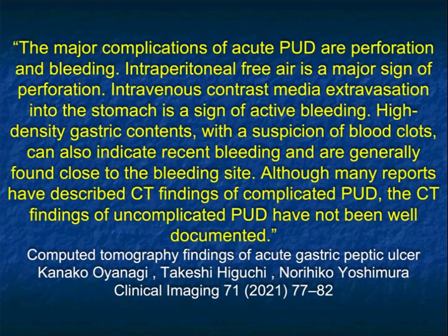We also, as I mentioned, like to use IV contrast. Without IV contrast, it's really impossible to see active bleeding. You can see blood in the stomach, but you don't know if it's active bleeding on a non-contrast scan. There are several pitfalls. Obviously, patients with medication, for example, Maalox has high CT attenuation and can very much simulate blood in the stomach because it's high density, but typically it's much higher density and layers posteriorly by the fundus. So that can be very, very helpful.